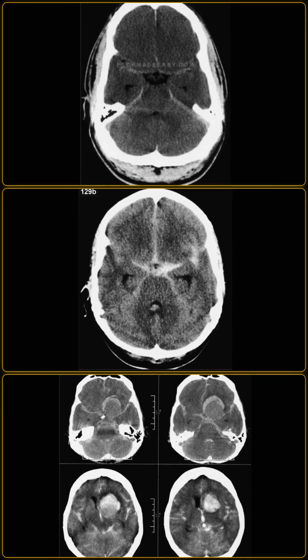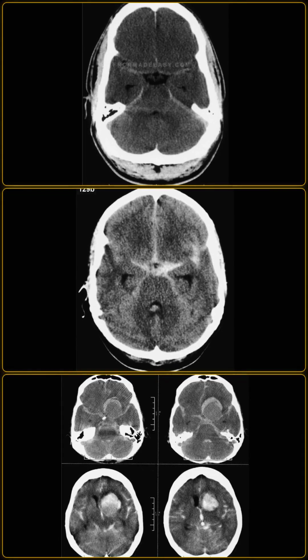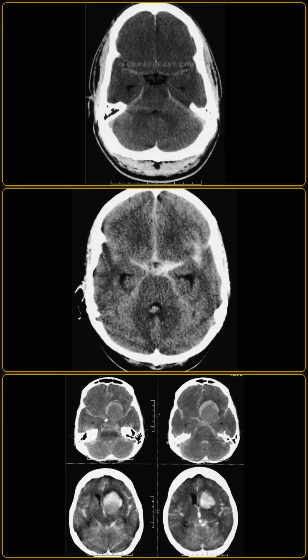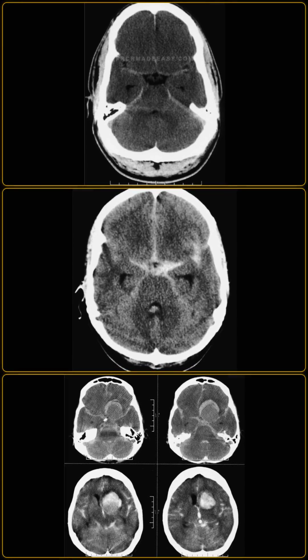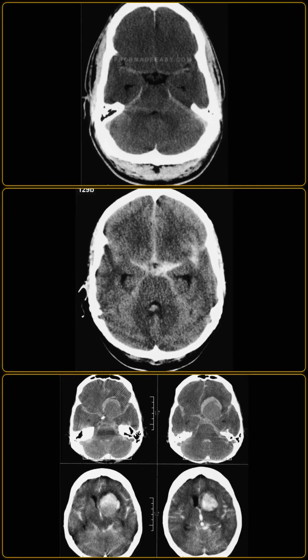The cortex and basal ganglia are highly metabolically active and selectively vulnerable to hypoxia, developing rapid cytotoxic edema and hypodensity. The cerebellum and brainstem are relatively resistant to hypoxia and retain their density, creating a reversal of the normal gray-white density relationship known as the reversal sign.